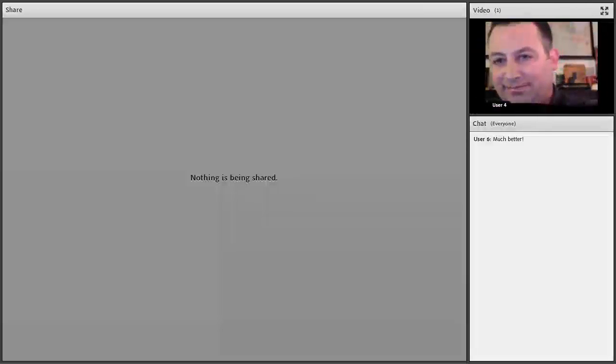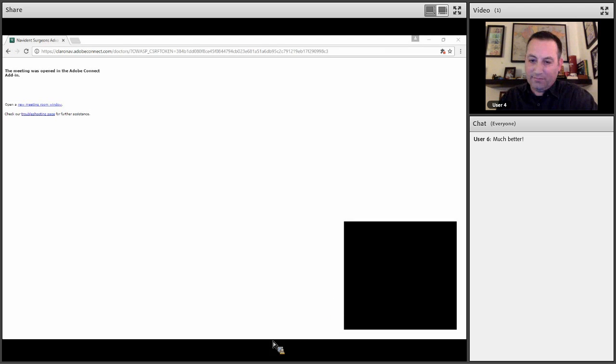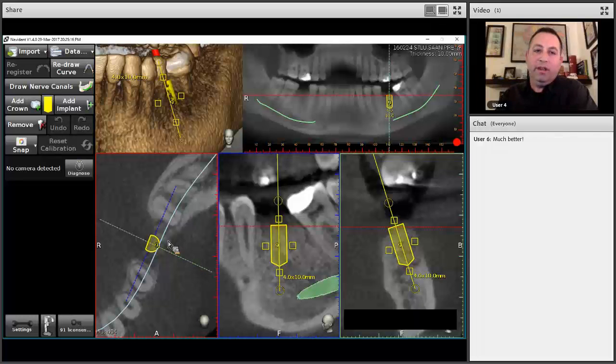Hi, everyone. So let me share my screen with you. Okay, so what I'm going to go over is the recording of the screen and taking snapshots, which are options that we have. And eventually I will show you how to export the patient's plan and archive it.